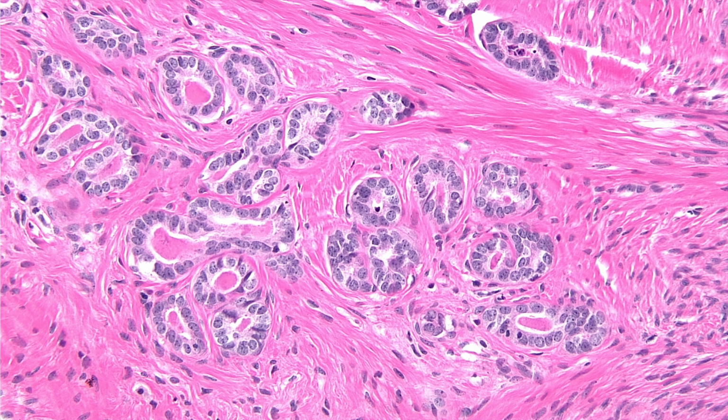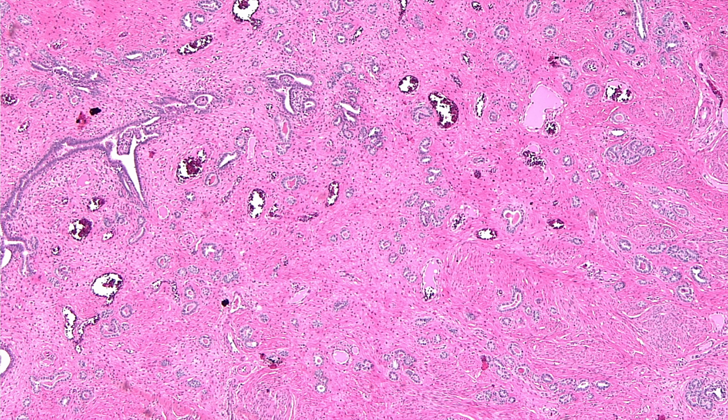These are embryonic remnants and proliferations of the mesonephric duct, which are normally located deep within the cervical stroma at the lateral aspect, so at about 3 and 9 o'clock. Histologically, remnants are characterized by simple tubules lined by cuboidal cells with bland nuclei and intraluminal, centrally located eosinophilic secretions. Whereas hyperplasia shows increased glandular density either in a lobular or ductal pattern.